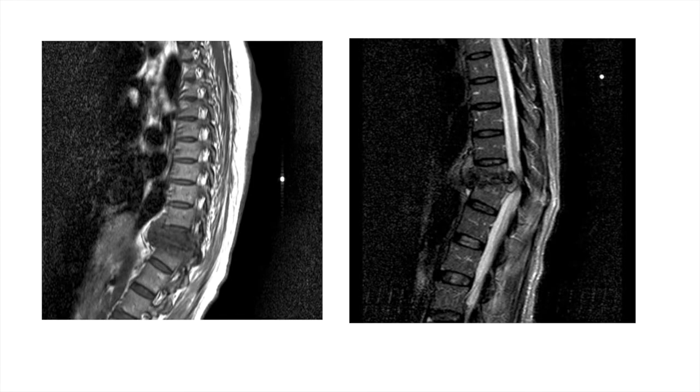So this is a sample of the MRI. You remember, they attack the lower part of the thoracic vertebral bodies, from T10 to T12, and the upper part of the lumbosacral spine, that means between L1 and L2. So just pay attention. You have to be able to diagnose this terrible disease in the early stage so you can save the patient.